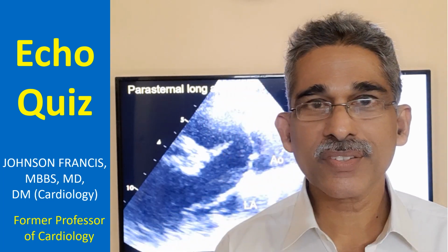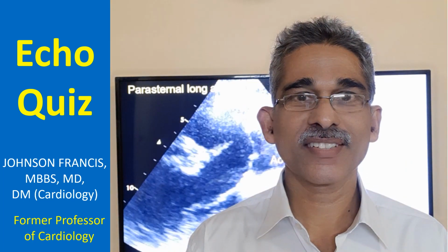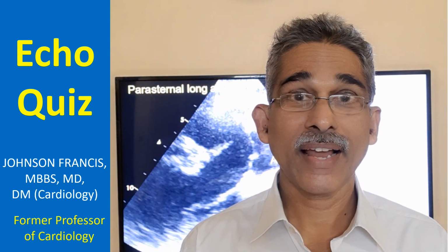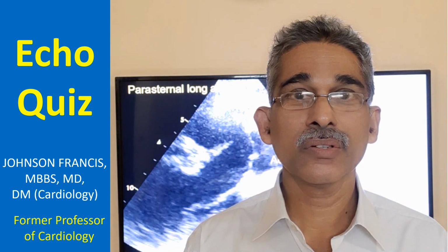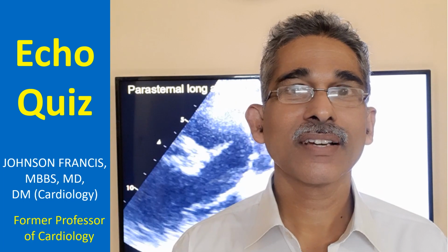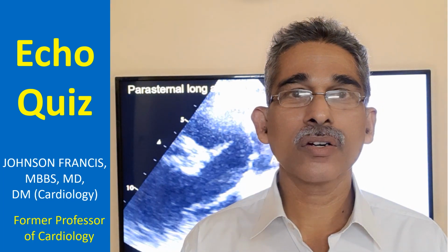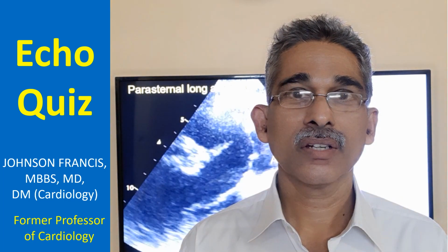Interpreting an echo quiz just from a single frame has a lot of limitations, but still, for an academic exercise, we'll try. Unlike the ECG, where a single image may be more informative, echo usually requires moving images. And moreover, even ECG requires a knowledge of the clinical background before interpretation to avoid errors.